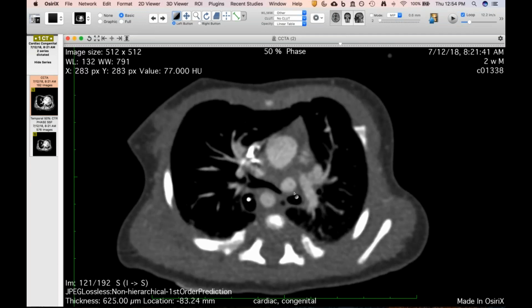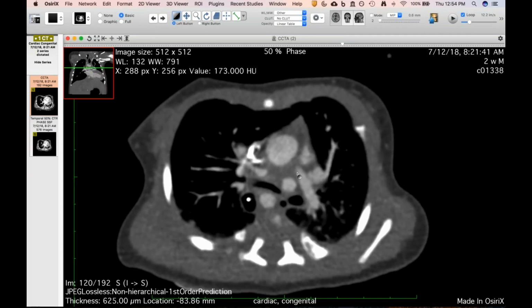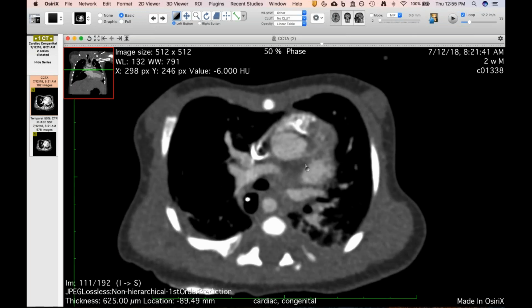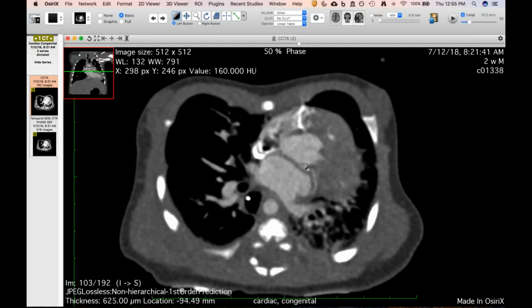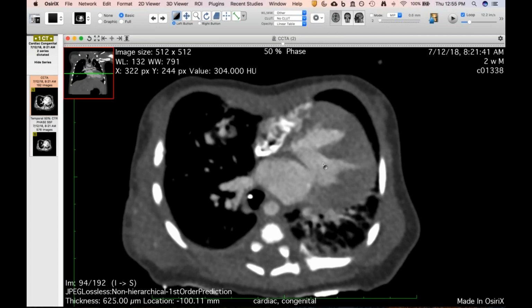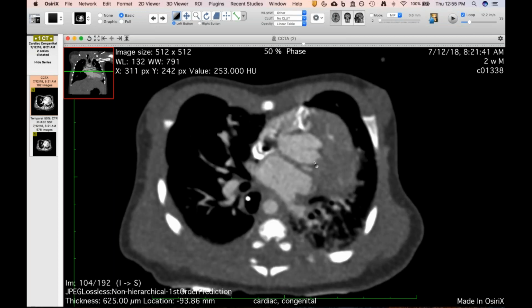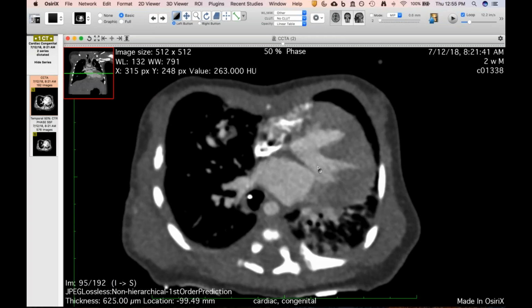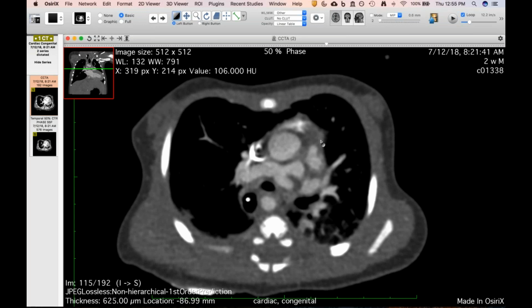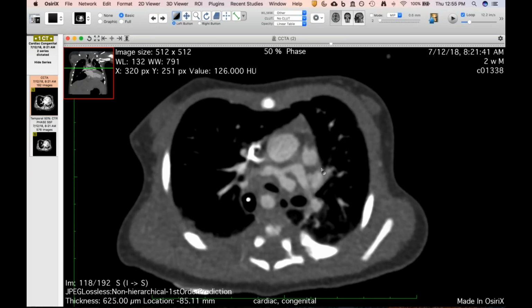And so this vessel here, actually, the ductus supplies both pulmonary arteries, as you see in this case. And that's because there is no proximal pulmonary artery. So it's a pulmonary atresia. And you can see here that there's a large ventricular septal defect and just a single vessel extending from both ventricles. So unlike Jeff, your case with the truncus, this is more almost like TET, except you have complete atresia of the pulmonary artery right here. I mean, this would be the RV outflow tract normally. And then this is the left atrial appendage here.